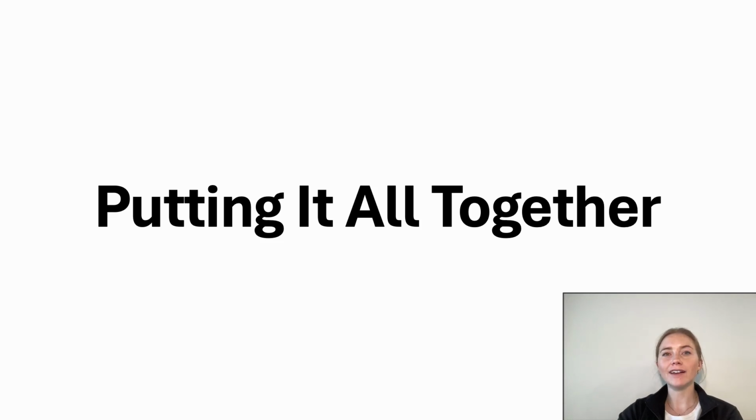We have reached the last section of the hand and wrist x-ray course, and we are just going to go over some examples of x-rays now to review everything and put it all together. So I'm going to encourage you to pause the video. We have 3 cases, and once the x-rays are on screen, I encourage you to pause the video and go through the x-ray yourself. Take a piece of paper and write down all the injuries that you identify, and then we can go through the approach together and see if you manage to get all of the injuries.